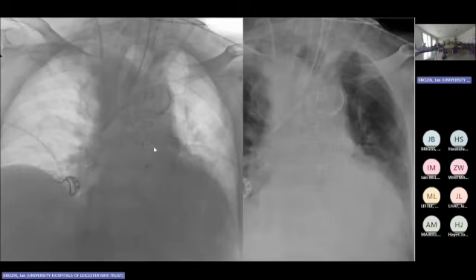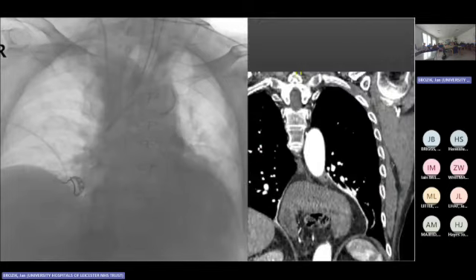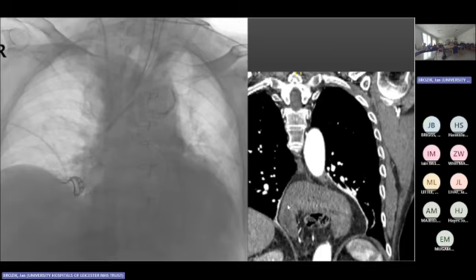But if you think about such a big loop, is there that much space in the lungs? Unless it was a pneumothorax. Yeah, so unfortunately, our patients don't follow our guidelines, and everyone is unique. And that was a CT that helped us to understand what was going on. The patient had a hernia, and I don't have that scan, but the esophagus was actually pushed to the side. So this is in the esophagus, and this is in the stomach.